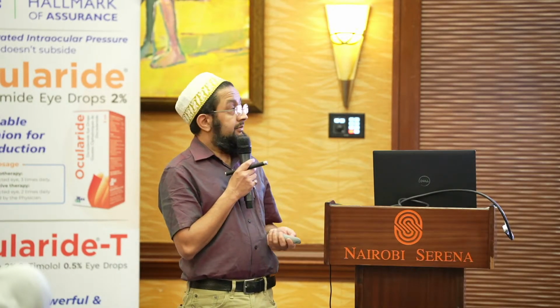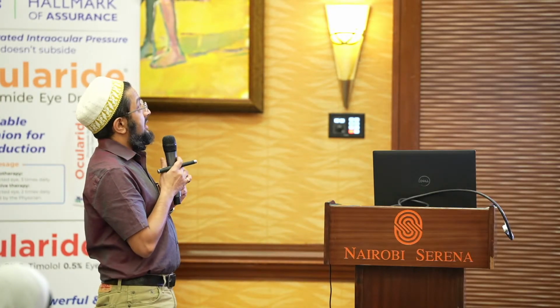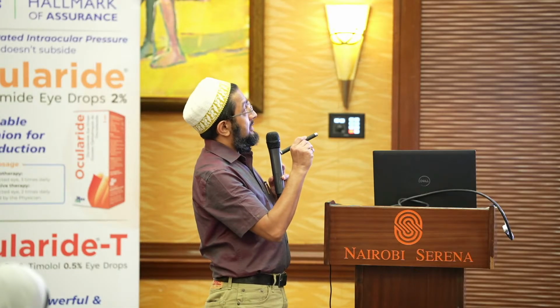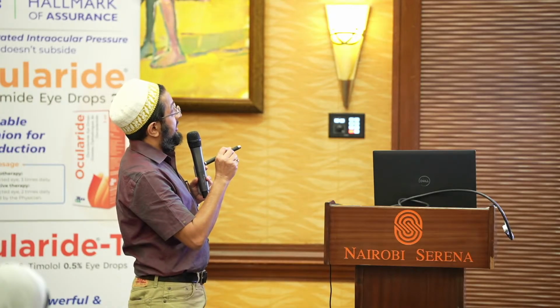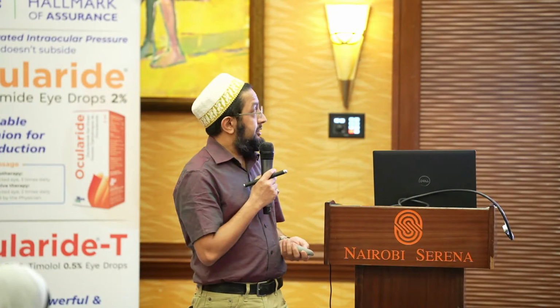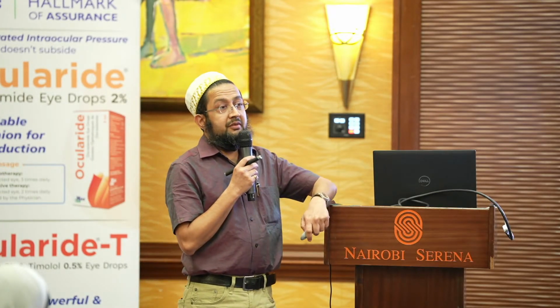This is TB. TB usually presents, you can see in this, the choroiditis. This is multifocal choroiditis. Here you see the TB lesions following the blood vessel. This is serpiginous choroiditis. And this is miliary TB, your classical 3 forms of presentation.